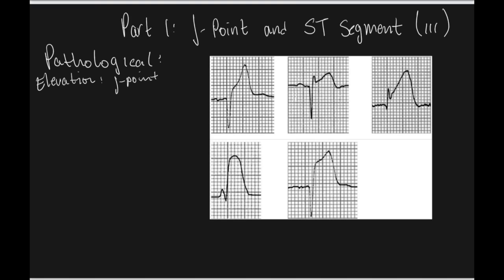And we know that elevation is elevation when it's greater than or equal to 1 millimeter in all leads except V2 and V3.